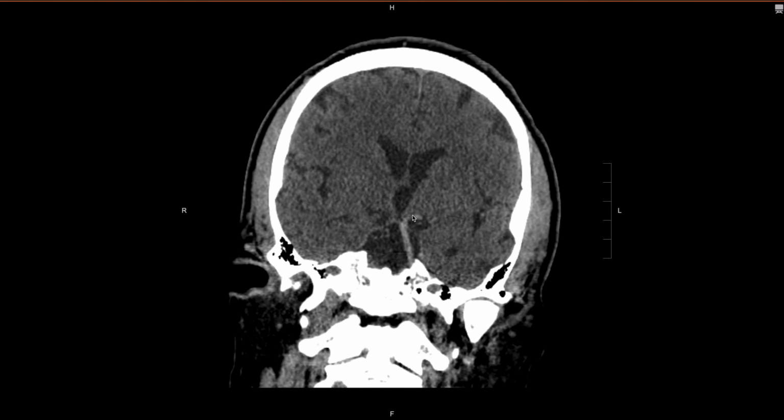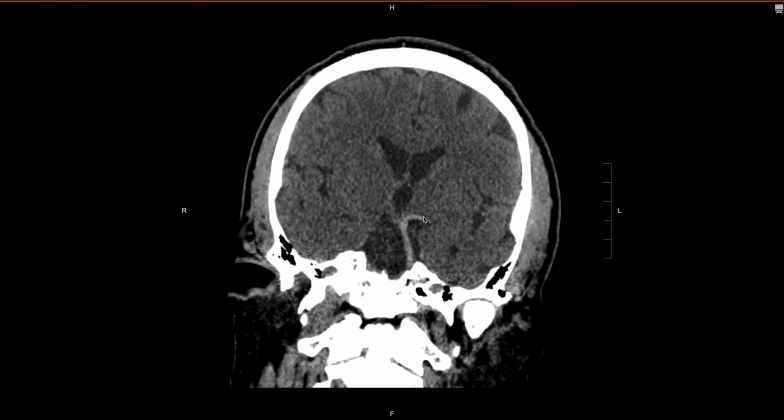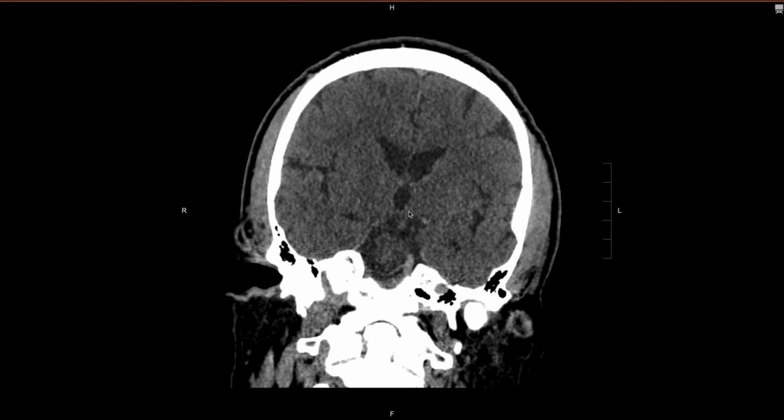When you see something like this, because it's not very specific, it's important to pick up the phone and call the ordering provider. Hopefully they're still with the patient, and you can get some more clinical context. And really, this finding, if it's present with most any neurologic symptom, it probably warrants getting vessel imaging, like a CTA, just so you can rule out this devastating diagnosis.